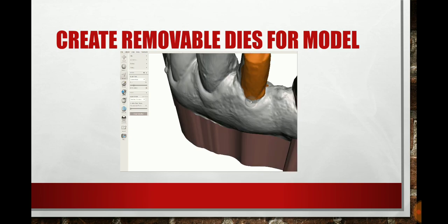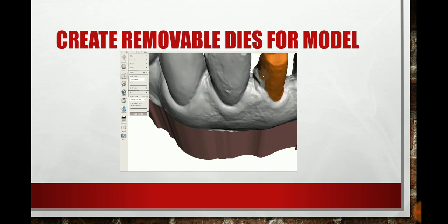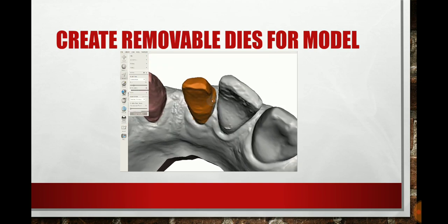If you looked at the other videos, you'll be able to see how I would prefer the models and dies to look after they're scanned. And we create the models, the scans, and that's how it is.